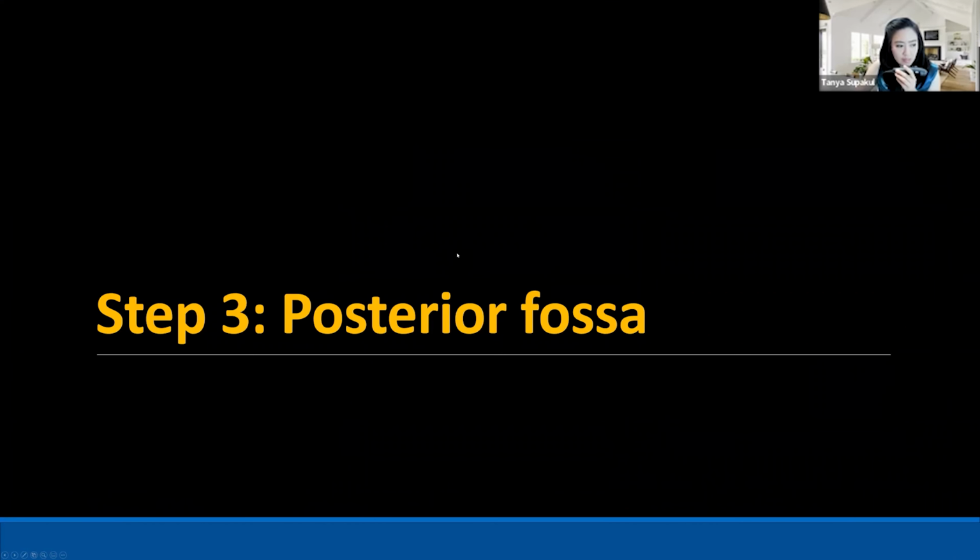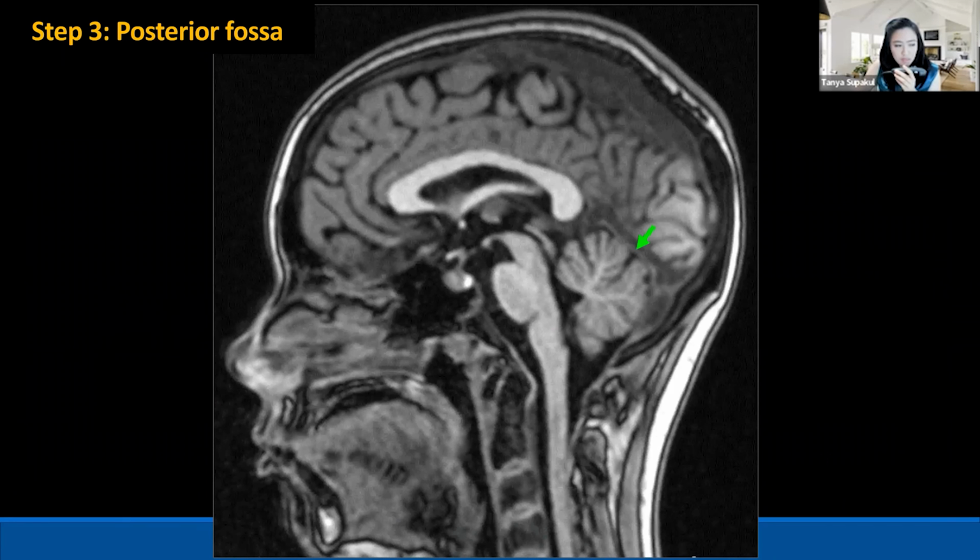So the next step is the posterior fossa. Any questions for now? You are still with me, right? So the third one is the posterior fossa. There are a couple of anatomical structures that we need to check.